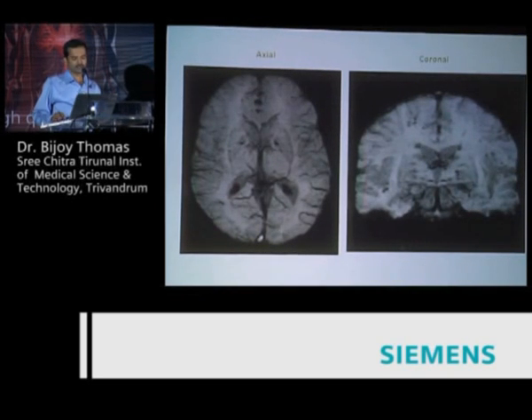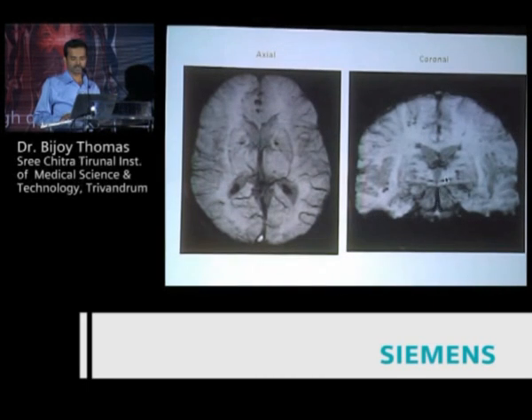Compared to that, the coronal SWI is not a good option, because SWI, as you know, is actually optimized in the axial plane. If you do a coronal SWI, you can see that the phase of the basilar arteries, which is supposed to be bright, changes to negative, and almost all the veins in the cortical area disappear. Because it's a complex processing method involved in the ultimate image contrast, you should not do a coronal or sagittal SWI as it stands today.